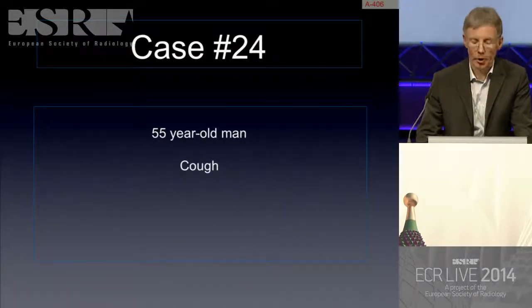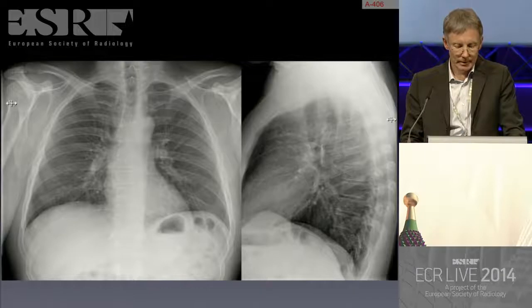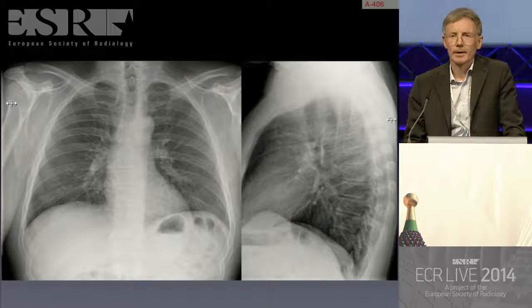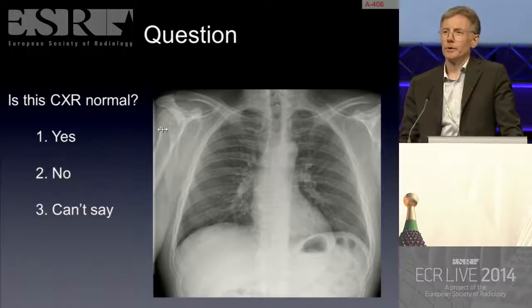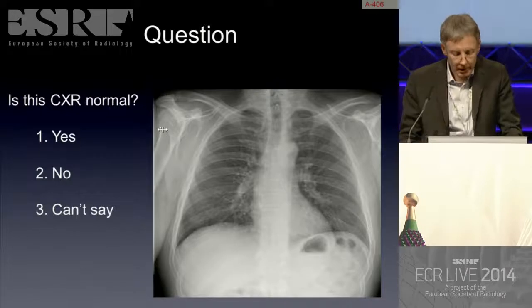Now, another man with a cough, 55-year-old. Let us look at this chest X-ray. Does the chest X-ray help explain the patient's symptoms? How would you report this film? Is the chest X-ray normal? Yes? No? Can't say.